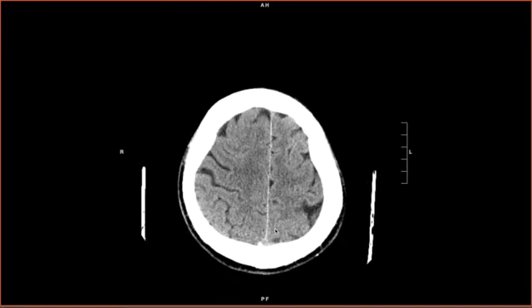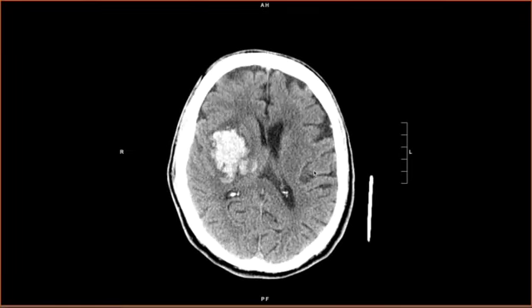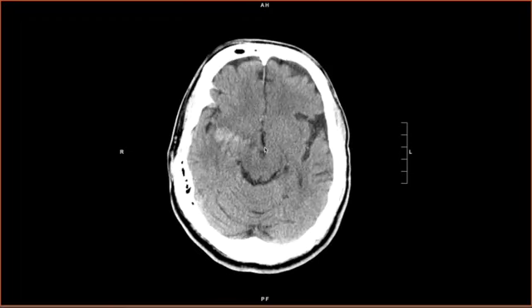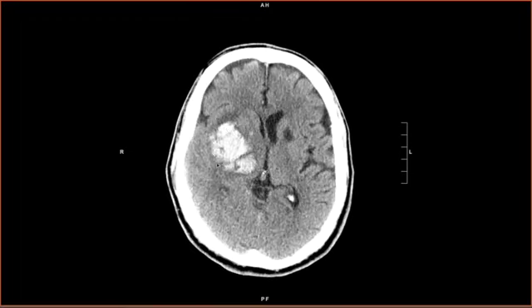And you still want to go through your full approach. We won't do it here for time's sake, but in this case, this is a classic hypertensive hemorrhage. Now, other things can cause blood in this area, but this patient was hypertensive, and we did vascular imaging to make sure there's no vascular malformation. The most common location for a hypertensive hemorrhage is right here.